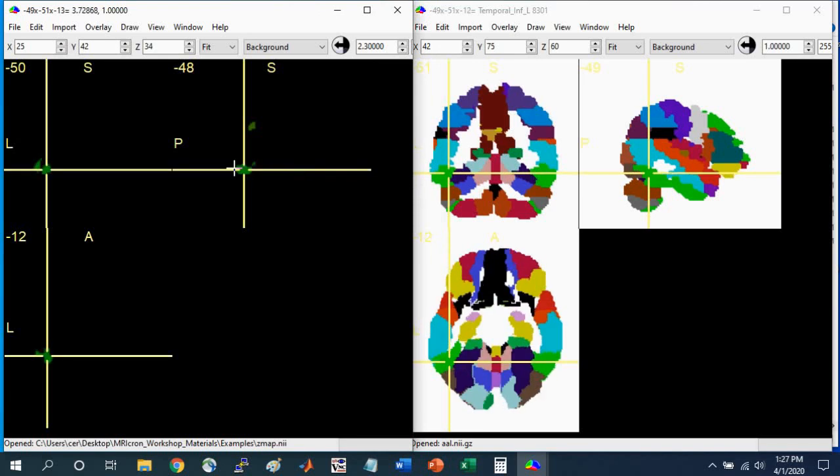And of course, another way you could have done that is just drawn these regions within the statistical map at the same time. But I'm demonstrating ways you can use MRIcron to get ROIs, split them, and combine them together again. The next thing you might want to do is assign different numbers to these clusters.